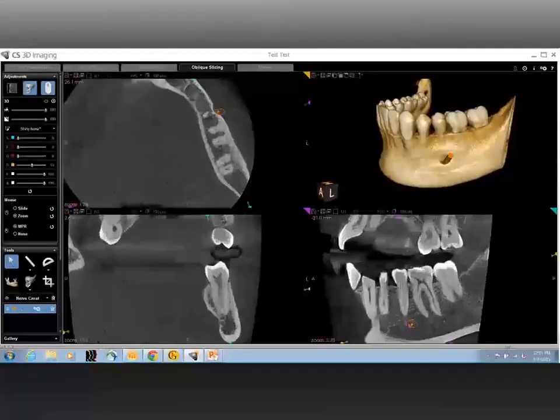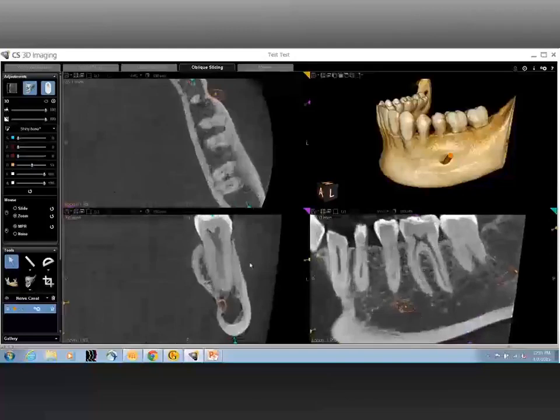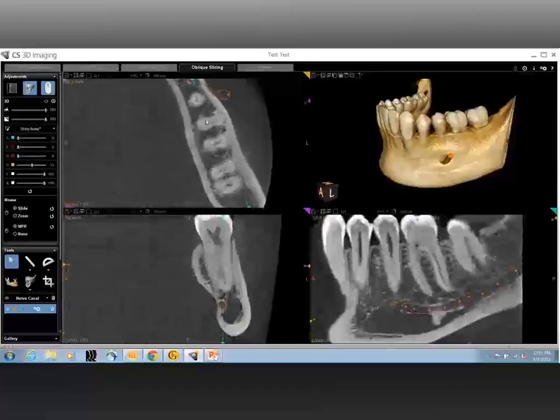So the canals themselves have to be evaluated, right from the pulpal horns to the apex, to the opening of the apex. You can clearly see that it has good value in adding the third dimension to visualizing the canals. You can also visualize it in axial sections where you see the pulpal horn. If there are any missing canals, you can identify calcified canals or even calcifications within the canal, certain isolated calcifications, pulp stones, or various other things.